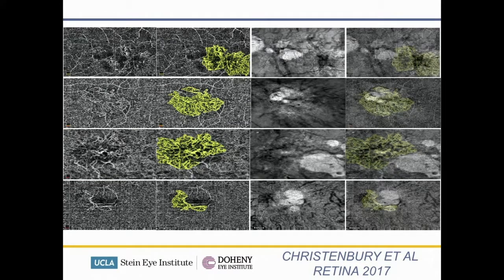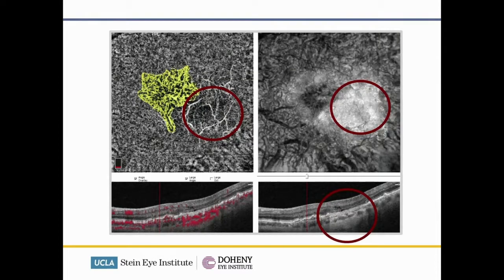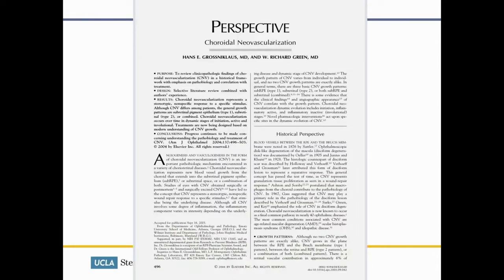Finally, I'll talk about type 1 neovascularization and atrophy. En-face OCT is a very valuable instrument in identifying and quantitating atrophy. In this particular study, we were able to map the areas of atrophy with en-face OCT and overlay the areas of neovascularization and see that the area of atrophy develops and progresses away from the neovascular focus. You can again appreciate that here: the en-face area of atrophy identified by the choroidal hypertransmission, the area of neovascularization by OCT angiography, and the area of atrophy progressing away from the neovascular lesion.